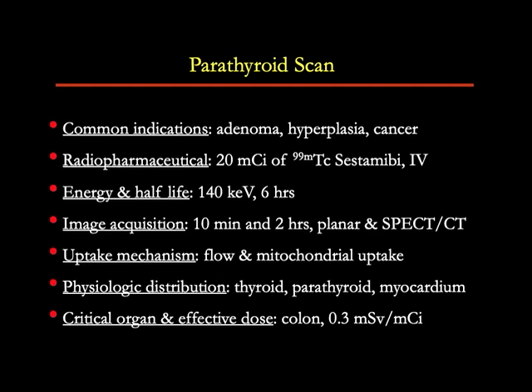The radiopharmaceutical uses 20 millicuries of technetium-99m sestamibi, which is injected IV, and 10 minutes after injection and 2 hours after injection, we acquire planar images of the neck and planar images of the chest. We review those images and decide whether we need spot views or a SPECT CT.